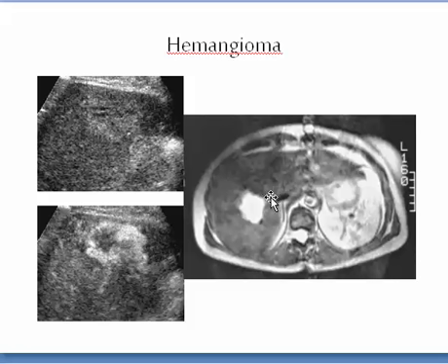Here we have the MRI in T2 weighted images seen as a hyper-intense lesion, and in ultrasound seen as hyperechoic, while after contrast it presented the same nodular marginal enhancement.